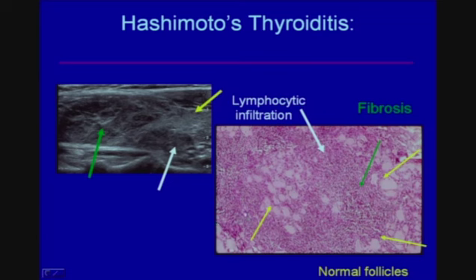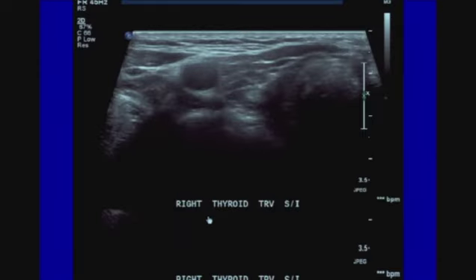When we look at our thyroid gland, the yellow area here will show us some preserved parenchyma, relatively normal appearing thyroid over here, the lymphocytic infiltrate appearing as these hypoechoic areas, and then these bright lines representing areas of fibrosis. So a very asymmetric distribution of a diffuse disease throughout the gland, just recapitulating what we see under the microscope, what our pathology colleagues have realized for a very long period of time.